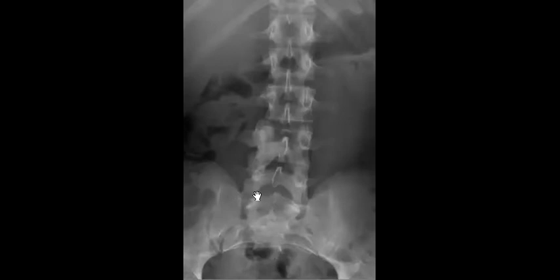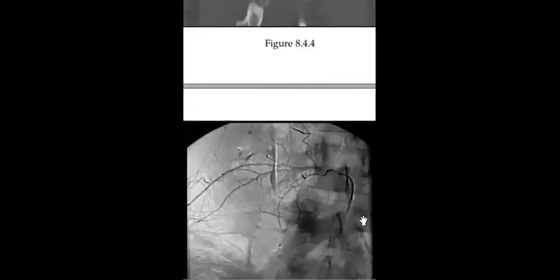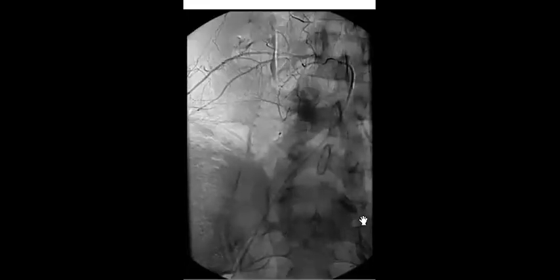Okay. And as we mentioned, in the CT it can have a vascular nidus, and sometimes they go through preoperative embolization. The angiography, as in this case, is not a routine of investigation. And the hypervascular blush can happen with everything, it is non-specific.